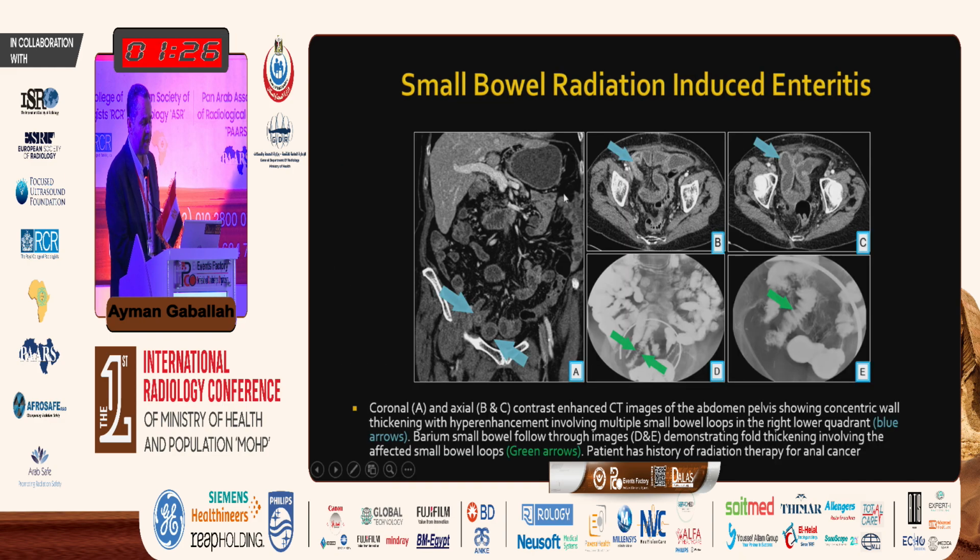One more case of radiation enteritis. Patient had history of anal cancer and radiotherapy, and you can see the bowel wall thickening, really nice small bowel follow-through, and you can see the thickened bowel and also the thickened mucosal folds.